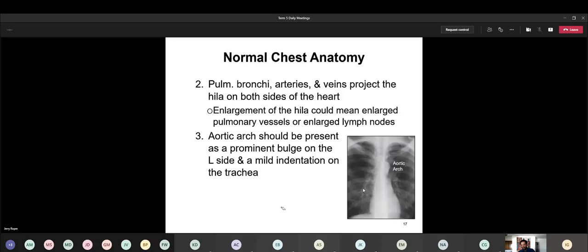So then when we look at our pulmonary bronchi, of course, right main stem is what I was trying to do on the other images, right bronchus, left bronchus, arteries like that, the actual aortic notch or aortic knob or aortic arch or whatever you want to call it, that should show up pretty clearly.